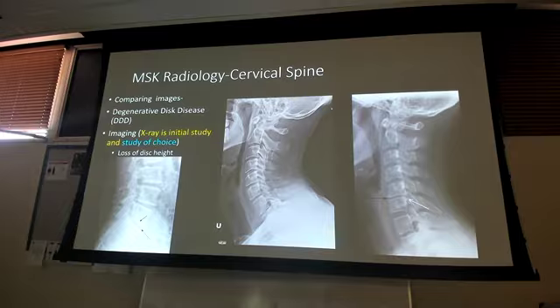Look at how thin and small that is, especially compared to the vertebrae above it, right? The same thing happens in the spine with degenerative disc disease. That disc space degenerates, right? We get the osteophytes, we get the inflammation, it gets narrower than it's supposed to, and that's what can cause some of the pain. You lose that range of motion, you also lose some of the disc height in there, you get those osteophytes. It's the same as those other arthritis we talked about in the knee joint or the hip joint or anything along those lines. That's why that layman's term is, it's arthritis of your spine. Helps the patients really understand what's going on.